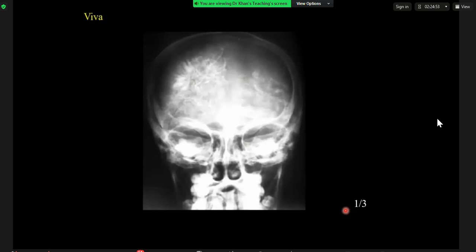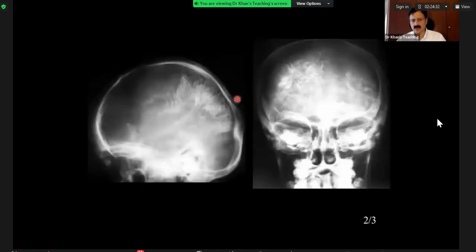This is very high density. You know, this pattern is an Aunt Minnie. There is nothing else in the world which will give you this appearance. Port wine hemangioma. This is not hemangioma. This is cortical, gyriform calcification, which is absolutely pathognomonic for Sturge-Weber syndrome.